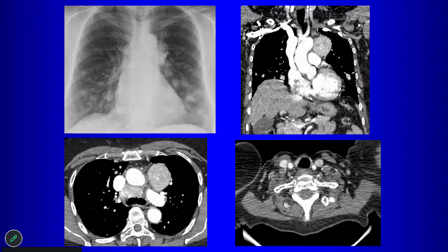So Sawan is going to give us a very nice differential now of hypervascular metastases. Carcinoid, renal, thyroid. What's that? Choriocarcinoma. Yeah. Those neuroendocrine tumors can give you an enhancing mass. So for this particular case, of the things you mentioned, what do you favor and why?